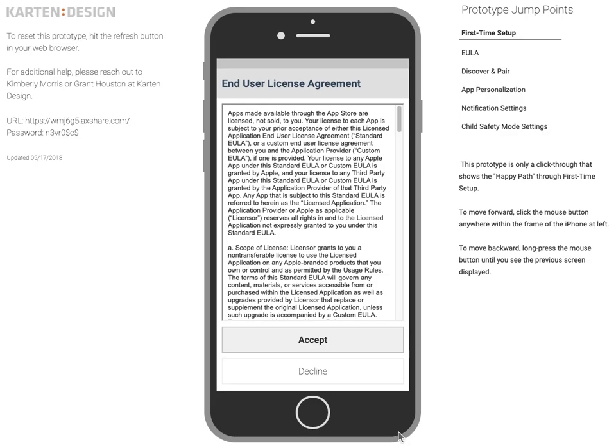This is one of the first prototypes we did early on in the design process, and it was related to onboarding and device setup. We knew there were going to be a bunch of different steps that needed to go in a particular order, and after you get into flows that are more than 5 to 10 screens long, having even a rough prototype is much better.